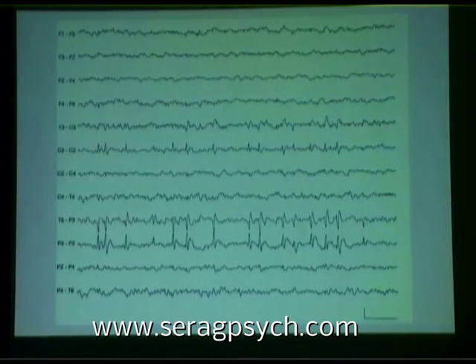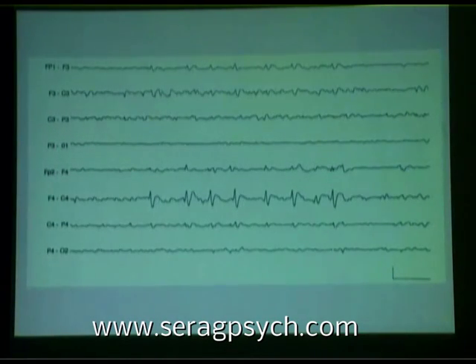Now, these are another example of abundance of children's spikes. This is a child. Adults don't do this so much. Very abundant P3 spikes, very, very focal here, spreading a little bit to C3. And in children, sometimes the quantity of spikes does not represent the severity of the epilepsy. It's a paradox. Focal spikes, I mean, focal. Next, please. And another example in children of abundant spikes. So you really can't give bad news to the parents just because spikes are very frequent in children. Next, please, in focal spikes.